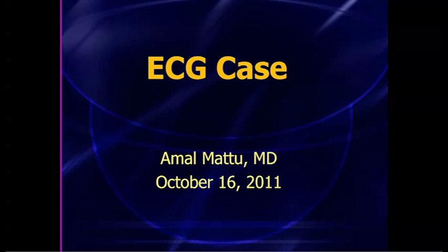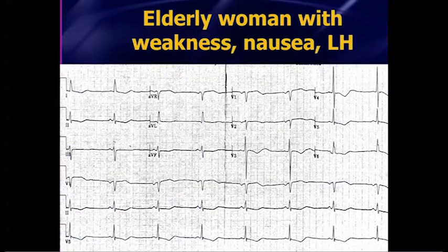And so anyway, welcome back. And we're going to go through a few EKGs that really focus on a very simple pearl to keep in mind for this week. And here's the case we're going to start with.